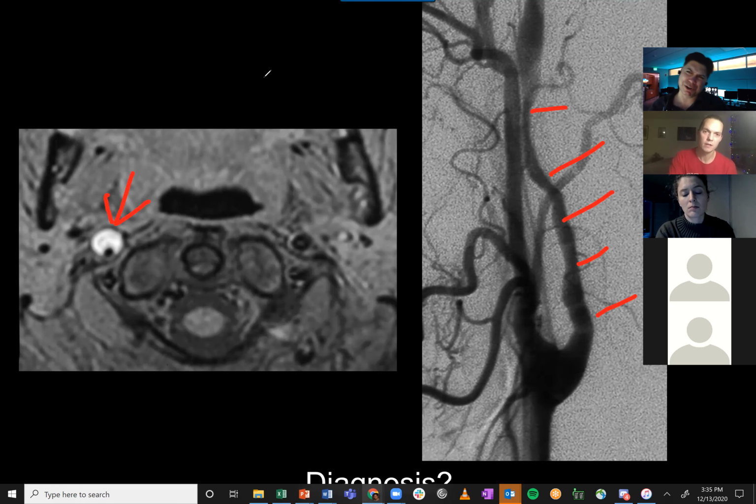He actually had this weird history. He was at a chiropractor. He suddenly had this weird weakness on the other side afterward. But we did the MR and this was all bright. Could that be bright if it just happened? Yeah. And then I see some irregularity now that I'm looking again at the DSA. Yeah, that whole blood vessel looks really weird going up there, right? Up here, it looks normal again, way up high at the top, but it looks normal down there.